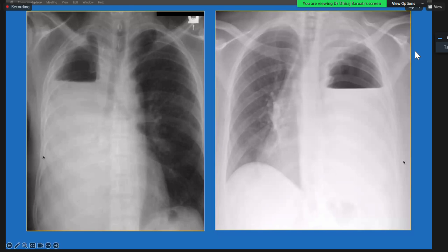This is probably a patient with lobectomy or pneumonectomy, where you see the cavity filled with air and fluid, and this is probably a patient with hydropneumothorax with collapsed lung, where the mediastinum is displaced. You will have to know the history, or look at other features or clues to arrive at a diagnosis of why you see the air fluid level. Sometimes it is difficult, I understand, but features like widening of intercostal spaces and displacement of mediastinum will help you make a diagnosis of hydropneumothorax causing displacement, versus pneumonectomy with air fluid level.